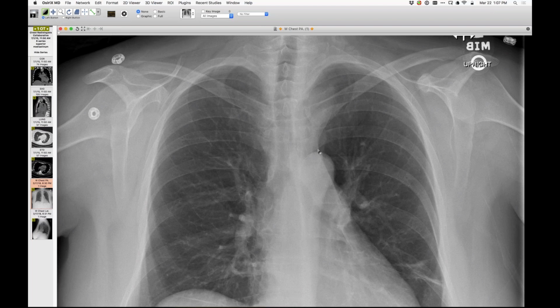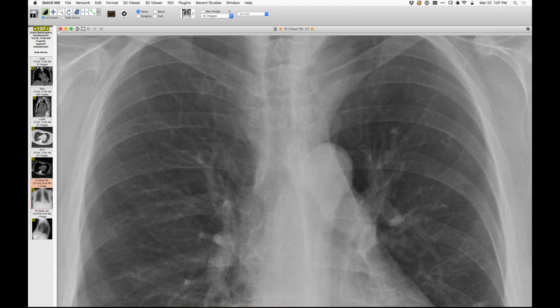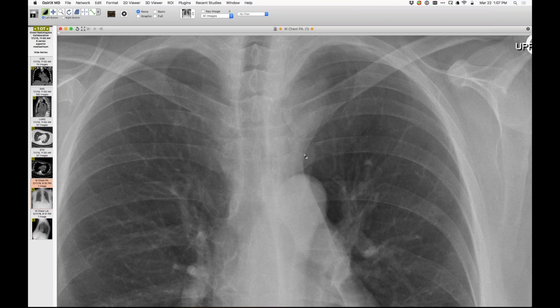Then when we go up here, we see this interface. And that's fine so far, except over here it goes lateral. I'm going to make that bigger to show that the interface is well defined till about here. Then it disappears. It starts to disappear at the level of the thoracic inlet, when the thing no longer contacts aerated lung.